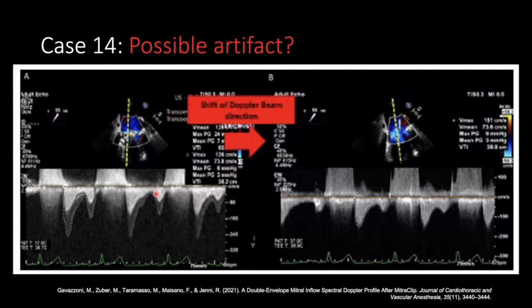some turbulence to it. So there are some studies, I've actually linked them here, so please feel free to read them, that show that there's more of a vortex flow at high velocity right at the vessel wall, and that's what you're catching. There's another group of people who think that when you're putting in these mechanical valves, you're also compressing part of the subvalvular apparatus. And so what you're catching is a bit of flow acceleration because of the subvalvular apparatus, and that stenosis is what's causing the double envelope. Not entirely sure what the answer is, but I would be happy to hear if anyone has thoughts on this.